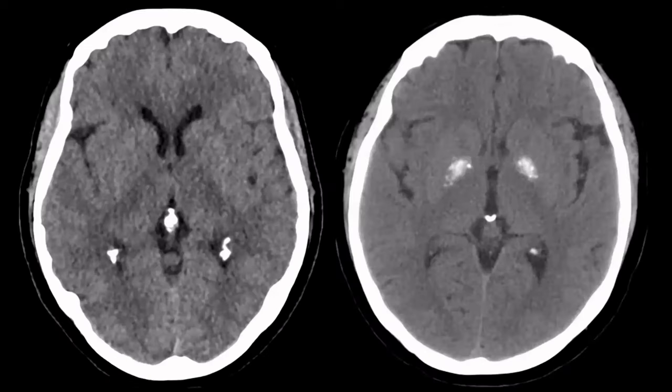There are some densities that are physiological, and you should not confuse them for pathology, as sometimes happens when a young resident is on call for the very first time and is afraid to miss something. So I have seen this happen in practice. The patients are okay because nothing was wrong with them to begin with. What are typical examples of physiological hyperdensities?